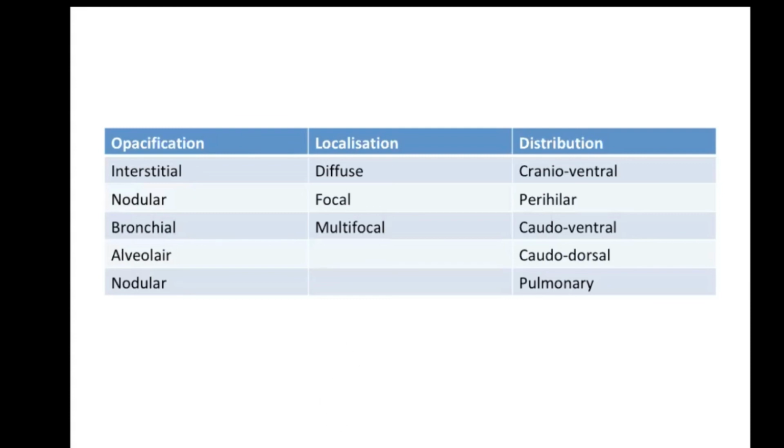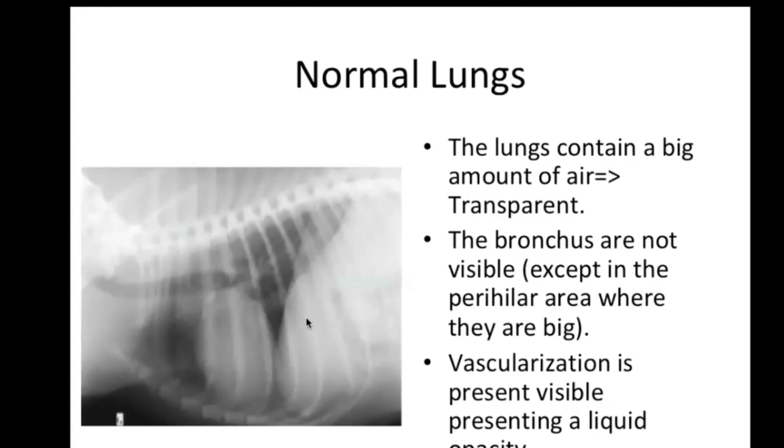Okay. So we're going to talk first about normal lungs. What do we see in the lungs usually? Okay. Can I have people tell me what they see in the lungs usually? What is this? All of this. What is it?